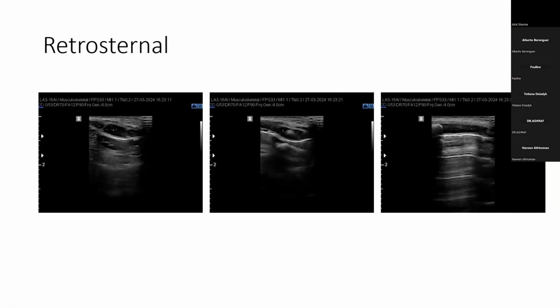So first, let's ask everybody else that right-hand slide. Who wants to have a go? It's the bottle of champagne question, guys. So please go for it. I promise I will ship it to you. So on the right-hand side, we have no sliding and an A-profile. Is that correct? Yes, but there's lung pulse, I think, here.